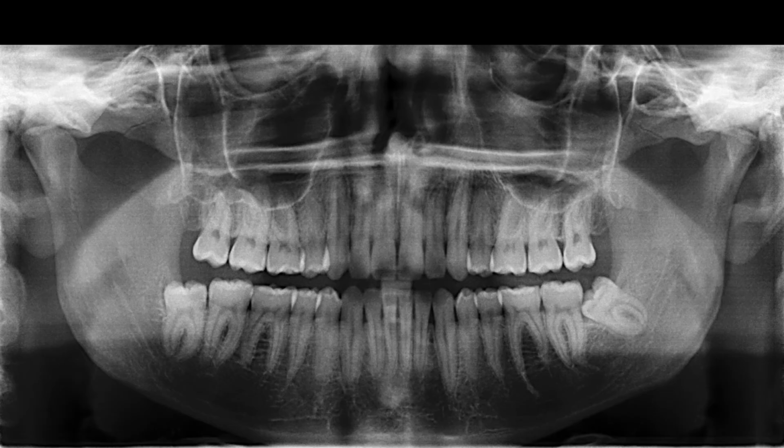So this x-ray is not great. Dentists don't use this x-ray to check for cavities. I mean, if the person has a pretty big cavity, it will show up on it, and you can see it on this, but for just very small incipient cavities in between, you need bite wing x-rays to check for that. And so that's pretty much it.